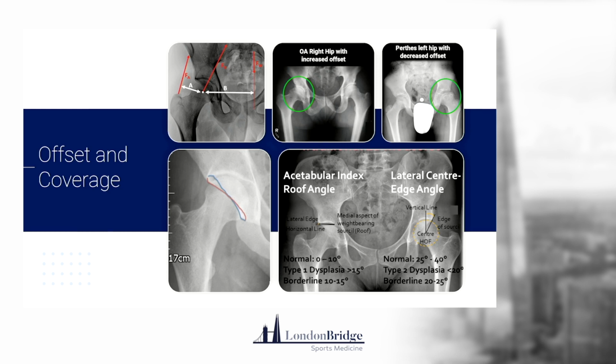So in the middle picture there, top right, you've got, I'm just going to get my mouse up. Here we go, here's a pointer. So you can see here, there's some OA right hip, and what that's done is actually effectively lengthened the femoral neck. So that's increased the offset. And what might that do? That might overload your abductors, and might overload the general gluteal muscle bulk, so you might have accompanying greater trochanteric bursitis or increased load of the general glutes.